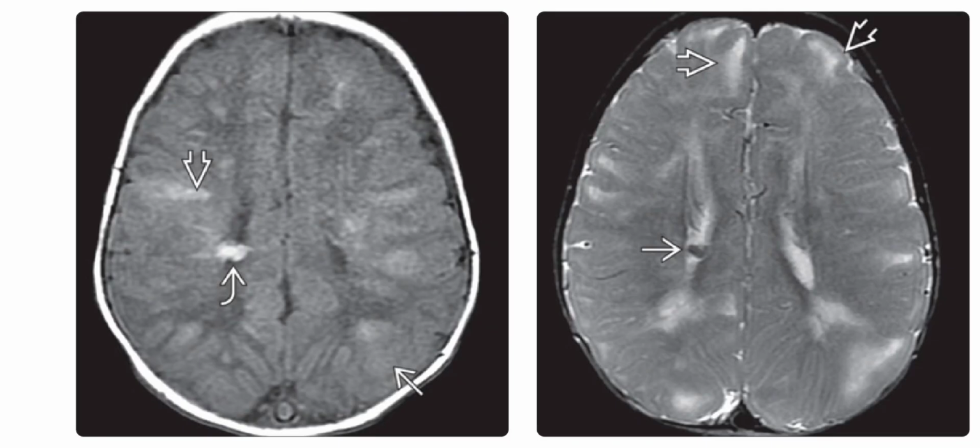Left is the axial T1 weighted MRI in a 13-day-old child, and it nicely demonstrates the multiple T1 bright subcortical tubers, the white matter radial migration lines, and a hyperintense subependymal nodule. The unaffected, unmyelinated white matter is hypointense. Right is the axial T2 weighted MRI in the same patient at 1 year of age, and it shows the T2 hypointense subependymal nodule and multiple T2 bright tubers. Some abnormalities evident on the prior scan are not appreciated here, and some tubers not previously evident are now demonstrated.